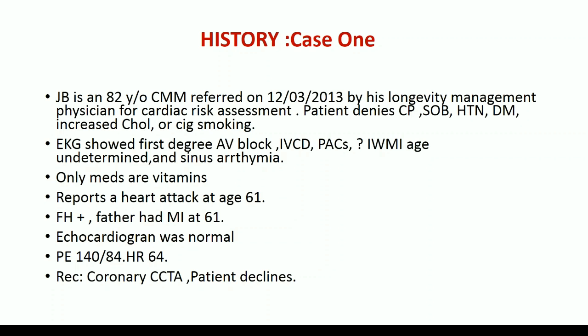And so to be able to read that vector in someone with left anterior fascicular block is very difficult. But the computer frequently puts that up if there's no little R wave in 2, 3, or F. And then a sinus arrhythmia, which is common also, more common in younger people. But certainly he met the criteria.